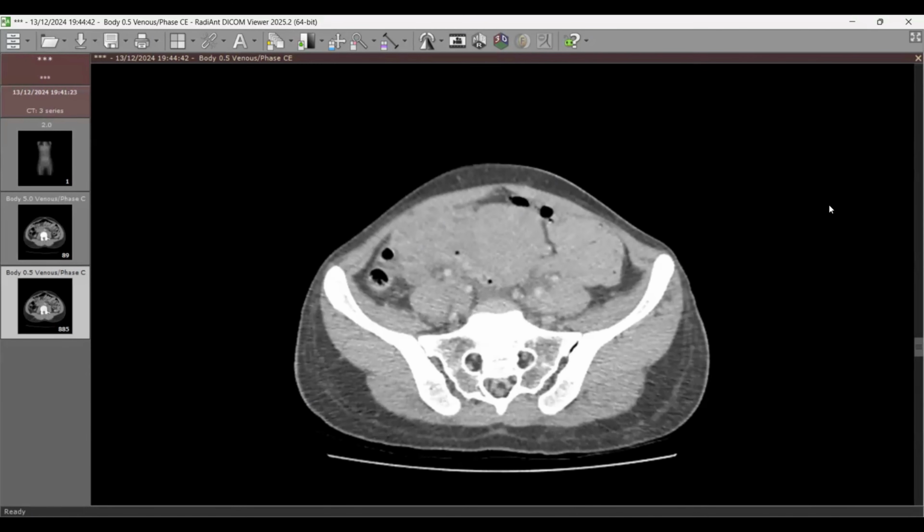So the first thing I would comment is that this is likely an abscess in the right adnexa, and as a result of it there is thrombus in the right ovarian vein, which is also dilated, and also extending into the IVC. I would immediately inform the on-call surgical team and refer this patient for thrombectomy, or removal of this thrombus, and the patient should be on anticoagulation.